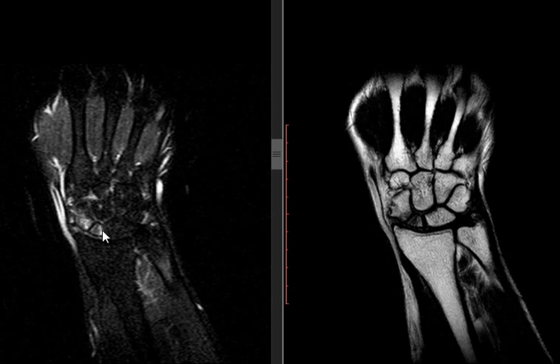When there is edema, this bone is still viable, not completely dead. Maybe they can save it. They open and put a screw inside, like they do in femoral AVN, screwing first to increase the blood supply and preserve as much as possible. So this is just a typical scaphoid fracture.